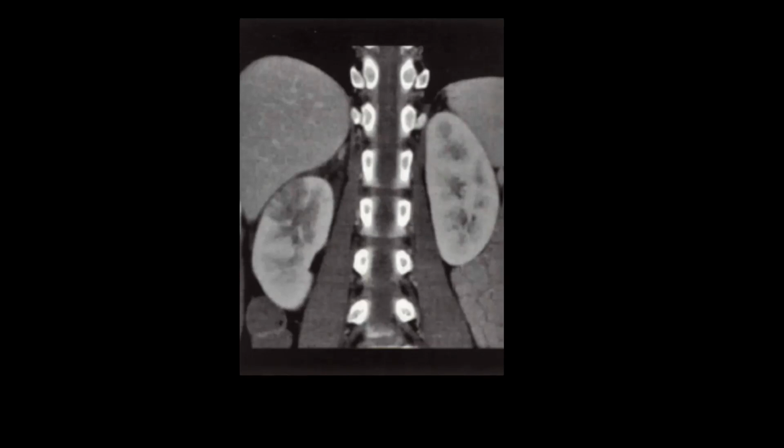We did a CT scan. This is the coronal images. You can see the normal outline and enhancement of the left kidney. While if you look at the right kidney, you can see this area of low attenuation in the cortex near the upper pole region. It does not have any mass effect, so you can see the outline of the kidney is very smooth. So we cannot call it a neoplastic lesion. And with history of dysuria and fever and flank pain, you can comfortably say this is most likely focal pyelonephritis.